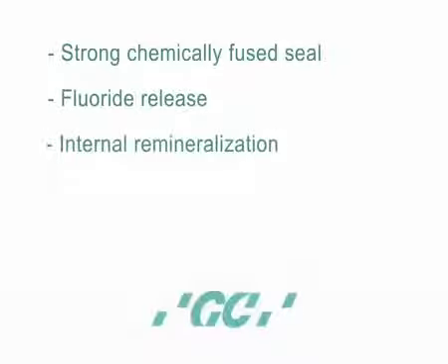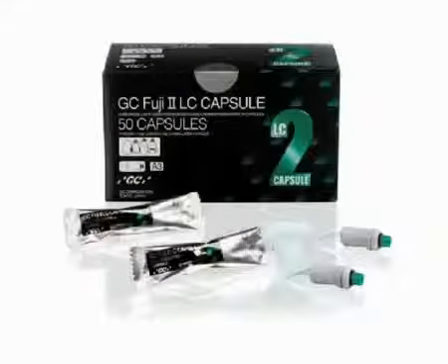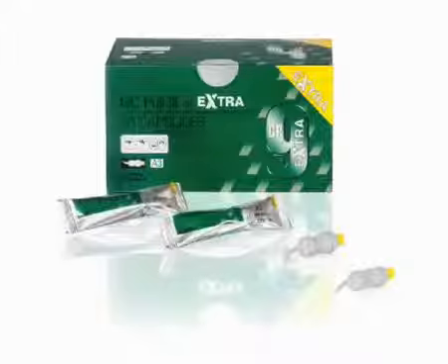In recent history, our understanding of the benefits glass ionomer cements offer has broadened. At the same time, GC Corporation has further developed the range and capabilities of cement technologies in the knowledge that glass ionomer cement remains the best adhesive interface option for the tooth.